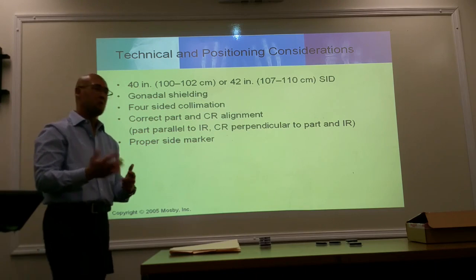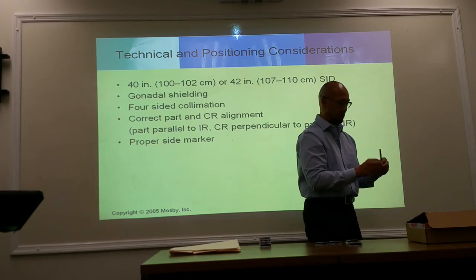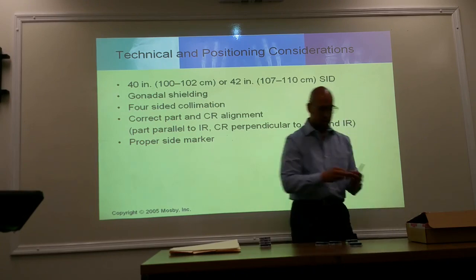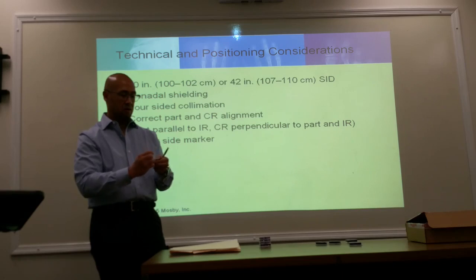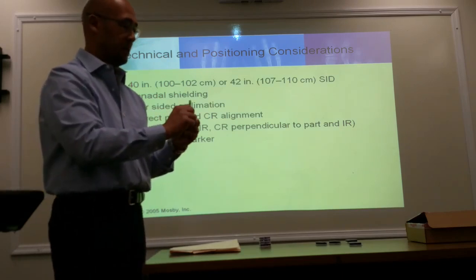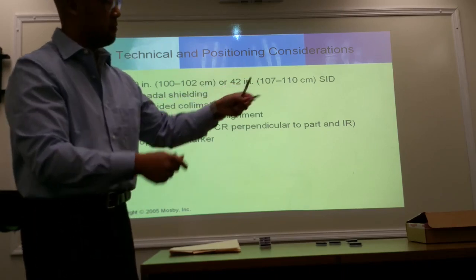You spend a little bit more, but they're really cool to have. They're $37. You on Amazon, Kristen? Is that 37 for both? Yeah. This is a Mitchell marker. So you guys can pass this around, but there's BBs located on the inside of your marker. And again, based on the location of those BBs, it'll tell you if it was done flat or in an upright position.